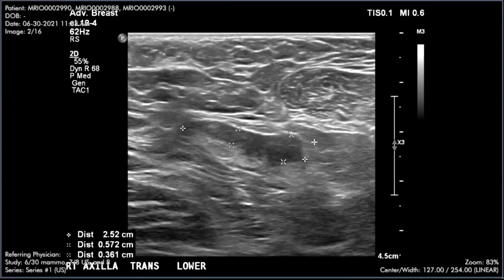This is unusual to have unilateral adenopathy with CLL, but it can happen, and this is a reason that we want to make sure we're following these patients to resolution of adenopathy, even when we think it's possibly related to the timing of a COVID vaccine. So this was a patient who was recalled from screening mammogram for axillary adenopathy. We did see some cortical thickening on her follow-up.